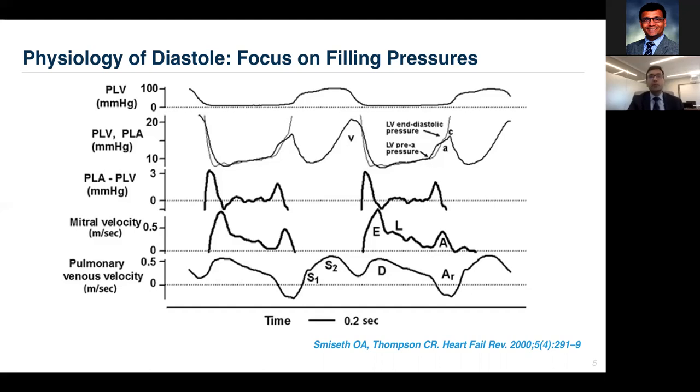The S2 is typically caused by the RV pressure pulse, which pushes the blood flow forward, with which the flow is moving inwards into the atrium. And also there's a contribution from the systolic descent of the atrioventricular plane. Therefore, the magnitude of the S wave is determined by the combined work of RV, LV, and the LA systolic function.